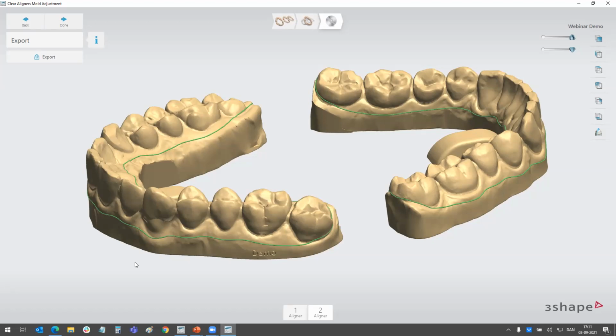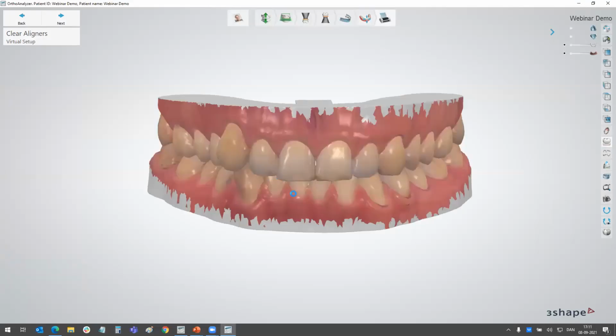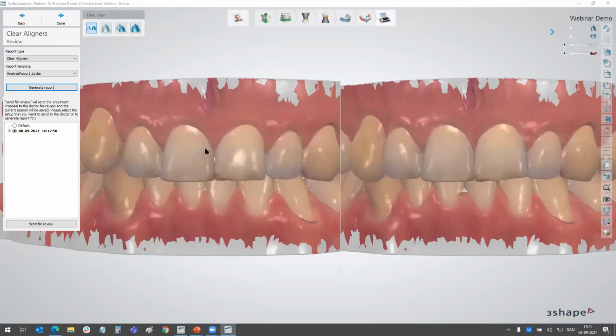Several questions here. Let's start from the end. Where will the lab choose treatment review availability? Yeah, we have made that very easy for you guys. There are several places that you can select that. You can do it in the control panel, but we expected that many users will likely not know that or forget about it.